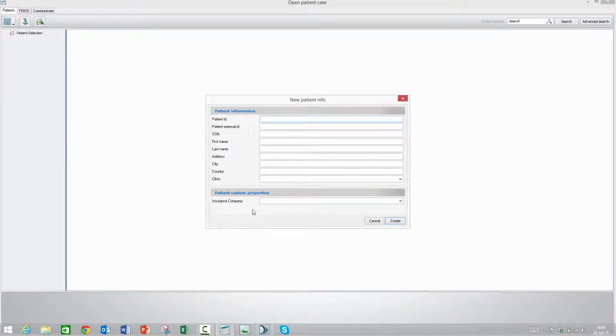I click on that field, and you'll see here I now have a couple of default values in my drop-down list, just like I made before. You can still enter other information, but at least you have some predefined features you can do here. Okay.